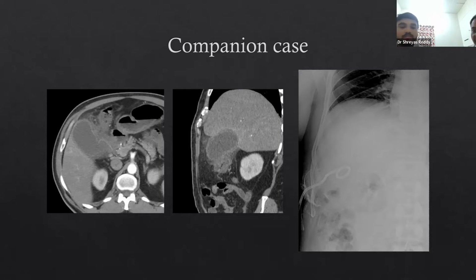These catheters hold it in place. So can you read the last image? What has been performed there? So this is an X-ray that is taken after the procedure. Here you can see the curled catheter, which is the locking pigtail that we have used to treat this patient.